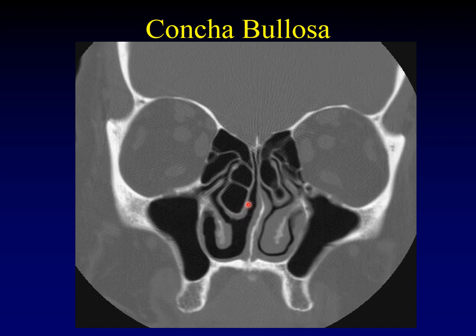Now, how much pneumatization counts as a concha bullosa? I think you'll find different people have different opinions. Most authors want it to go at least 50% of the way from the skull base to the tip of the turbinate to be considered concha bullosa. But really, anytime there's an air cell that can have pathology in there, it's probably worth mentioning.